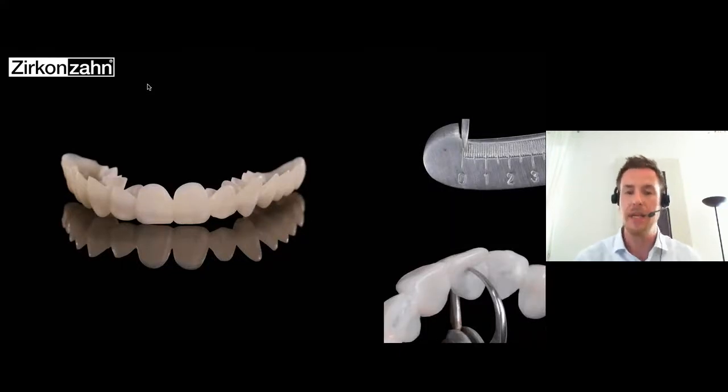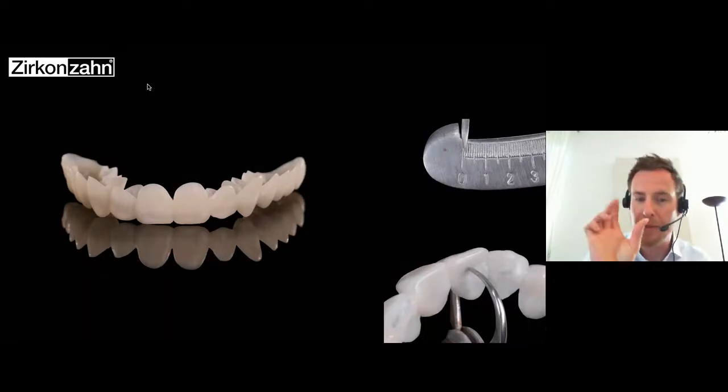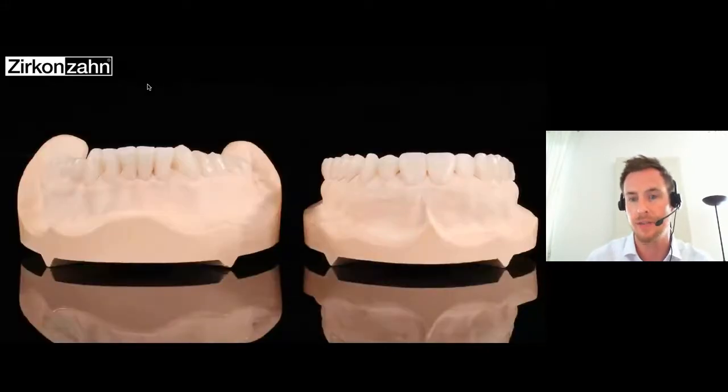For example, here in our multi-stratum flexible material, that's a polycarbonate material. It's a little bit flexible. It's a multi-layered polycarbonate, and it's milled down to 0.1 millimeter thin. So it's only certain areas, not everywhere, but it's stable enough to have certain areas at 0.1. And yes, we are able to mill down to 0.1 millimeters.